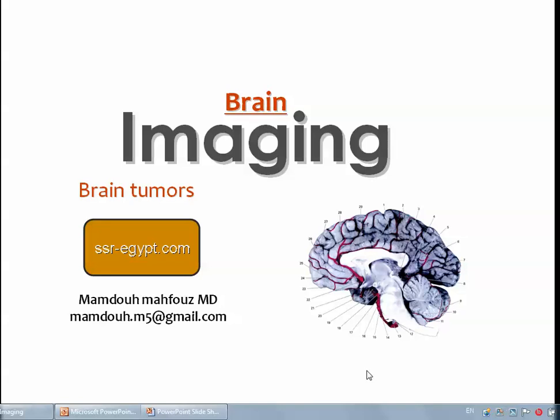In the first lecture we dealt with the normal brain anatomy and the techniques of examination. Then in the second one we explained some facts about the cerebrovascular lesions, and we concentrated on the hemorrhage and infarction by CT and the MRI.